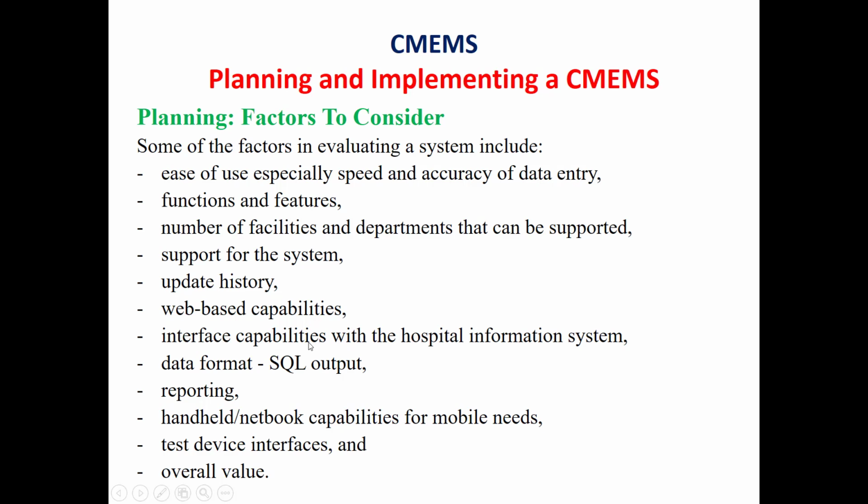This is important, especially if we have a limitation in the type of reports generated by this computerized medical equipment management system. Then the reporting, and the handheld netbook capabilities for mobile needs, in case we have different sites or a multi-site hospital or medical center.